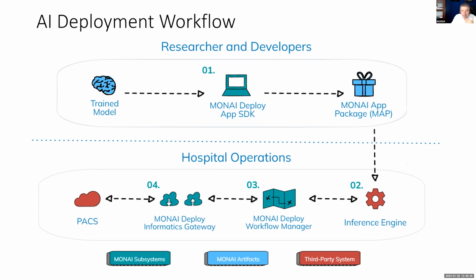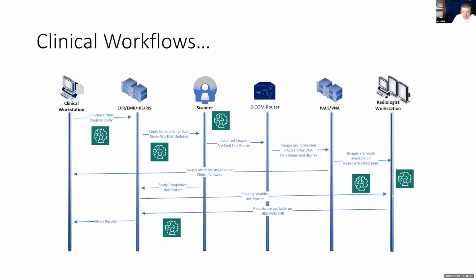But within this current App SDK, we'll be talking about how to take your algorithm and deploy it into a platform like this so it can execute. It can function within the standards of the current medical realms.